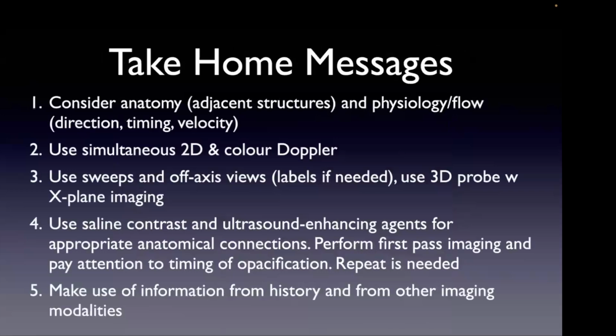Okay, all right. So let's go over some take-home messages. When you see funny things, consider anatomy. What are the adjacent structures and the physiology and flow? Look at timing, the direction of the flow, timing, systole, diastole, continuous. Velocity, high velocity, low velocity, in terms of where flow is coming from and where flow is going into. Use simultaneous 2D color Doppler, so color compare or simultaneous imaging.